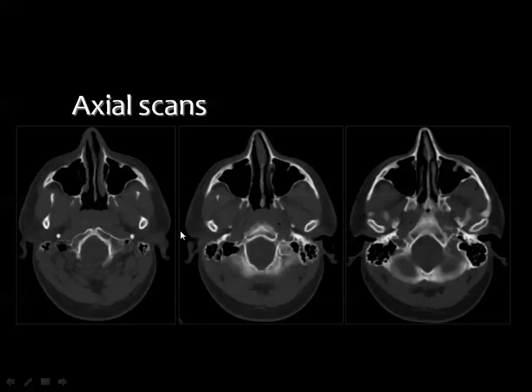In here, the maxillary sinus, the zygomatic bone, and this is the mandibular condyle, will articulate with the temporal bone in the region of the temporomandibular joint. And this is the zygomatic arch, maxillary sinus, bony nasal septum, then pterygoid blades, and of course you remember this very narrow space which refers to the pterygopalatine fossa.